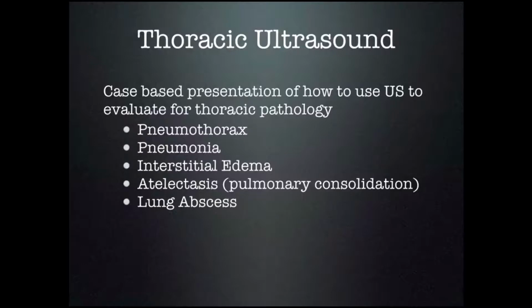So for this lecture, we're going to use a case-based presentation to demonstrate how to use thoracic ultrasound. We're going to learn about pneumothorax, the diagnosis of pneumonia, interstitial edema, atelectasis, and lung abscesses using thoracic ultrasound.